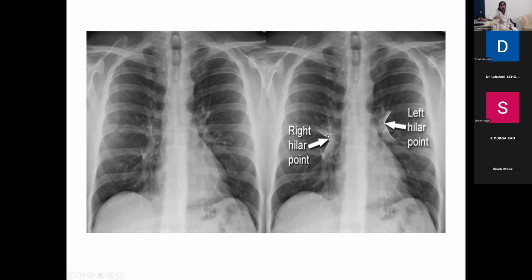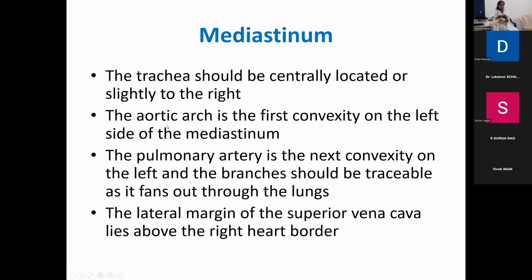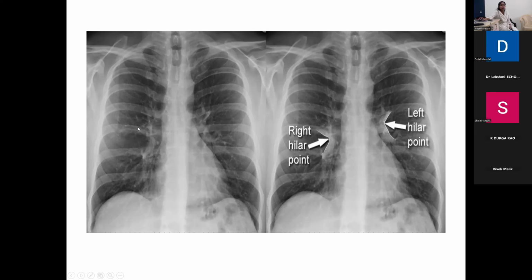So what do you look for in the hilum? You look for the concavity on the hilum. Most of them have doubts regarding whether there are hilar nodes or mediastinal nodes present. So you have to see this concavity. You have to imagine the concavity. And when there is loss of this concavity, then you have to suspect there is some node or a mass sitting at the hilum.